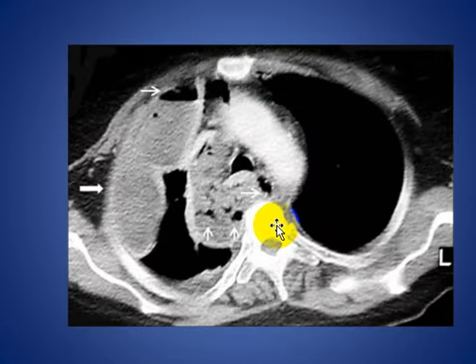Here, another patient with trauma and see mediastinal abscess here with multiple air bubbles and also loculated pleural effusion with air fluid level on the right side.